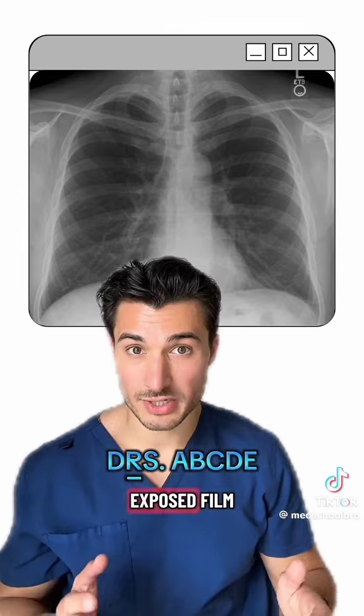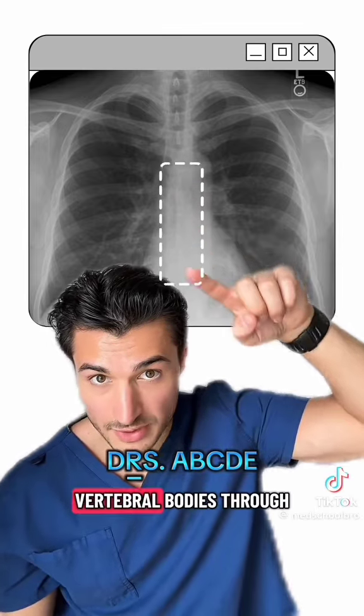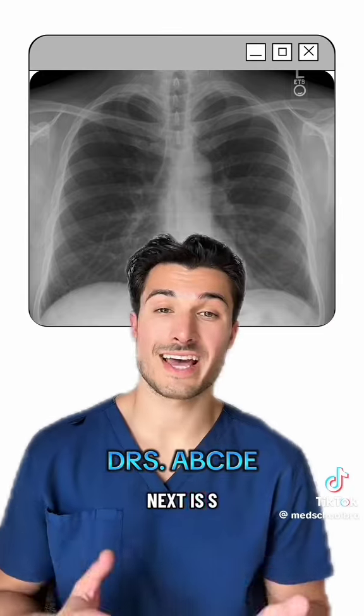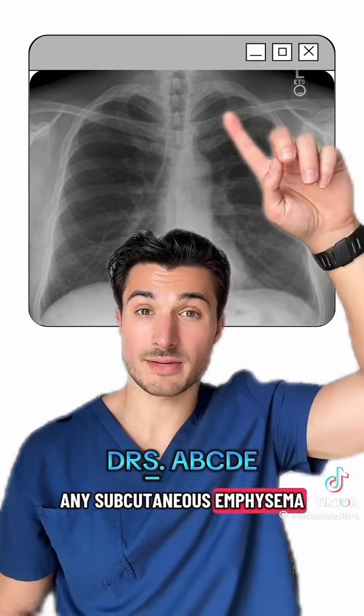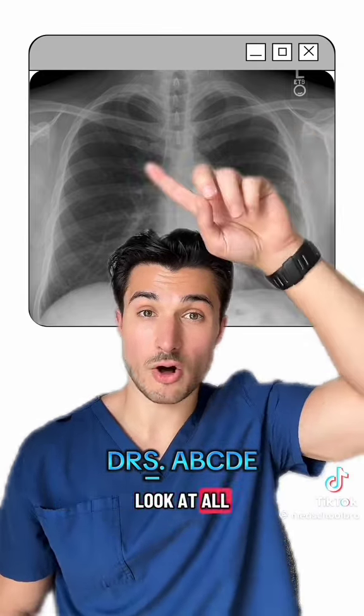The way to tell if you have a good exposed film is if you can just see the vertebral bodies through the heart. Next is S for soft tissues and bones. So look for any subcutaneous emphysema. Look at all your bony landmarks, your clavicles, ribs. Is there any fractures? Is there any lesions?